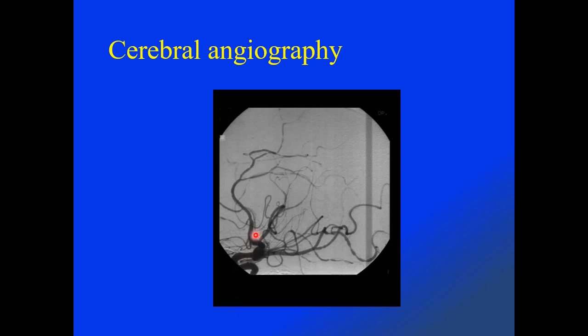Cerebral angiography on this patient demonstrates multiple arteries with irregular contour and what's known as beading appearance, with areas of alternating dilatation and stenosis within this PCA branch, as well as multiple MCA branches and distal ACA branches.